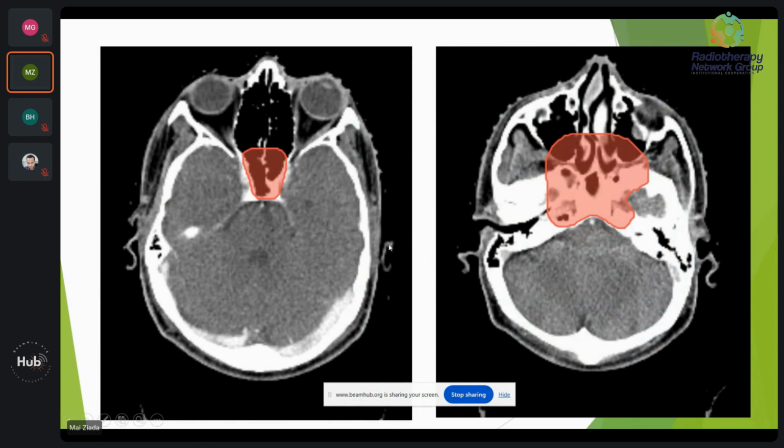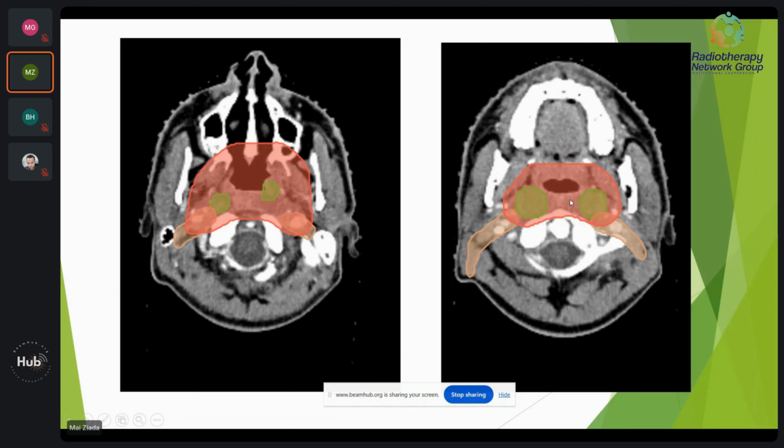When we started delineation for this patient, this was the highest level for the CTV 60, or the CTV high risk, included in the inferior sphenoid. Then we started taking the posterior maxillary sinuses and the skull base, along with going down. We've taken the pterygoid fossa.